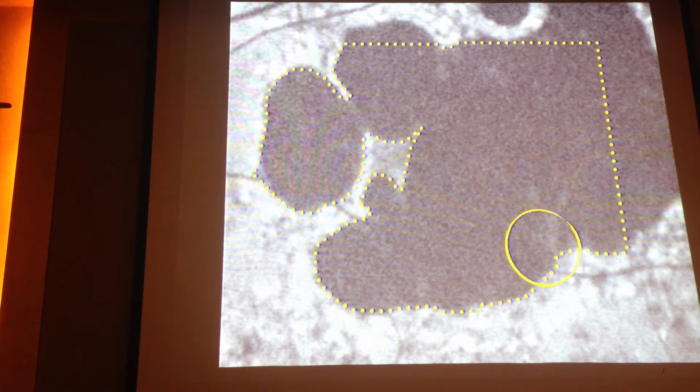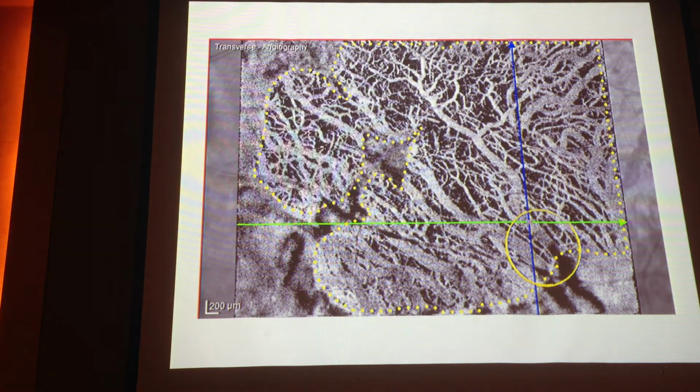So now, if we look at that point and we look at the angio-OCTs, we see that the huge choroidal vessel, from dark became all of a sudden white. White, yes. So the first presentation this morning was telling us that one of the interpretations of dark vessels in normal subjects is that the flow is too fast, and that actually was the first interpretation.